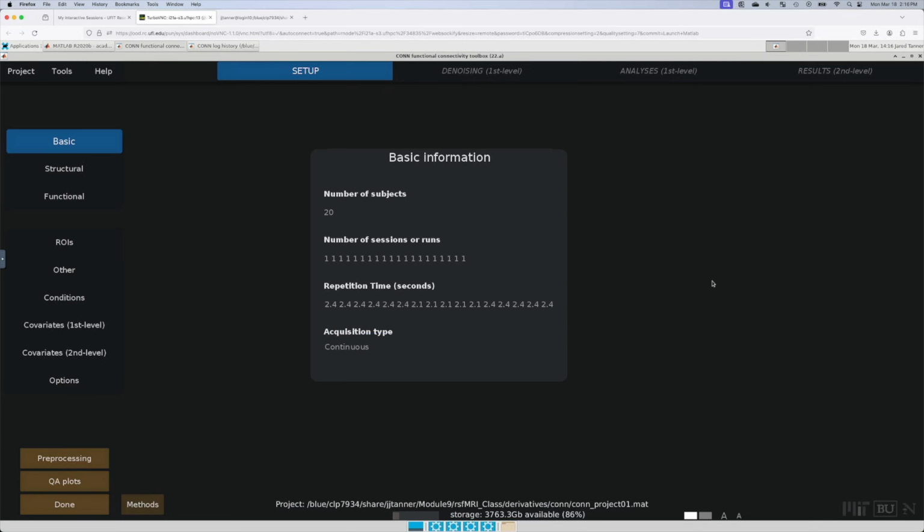And I'm using a Mac, but to get it to paste in here, the keyboard shortcut is actually a Control V. So if you're using Windows, it's a Control V, not the command. But even if you're using a Mac, still pasting in here is a Control V and not the command. And so it matches sort of the copy and paste from the Windows side.